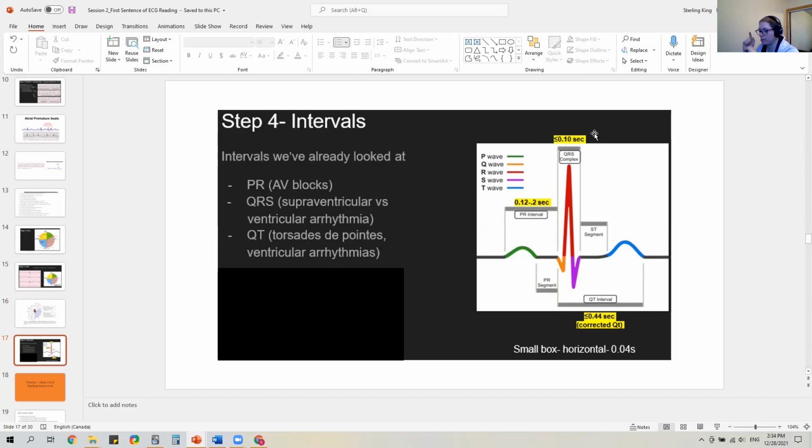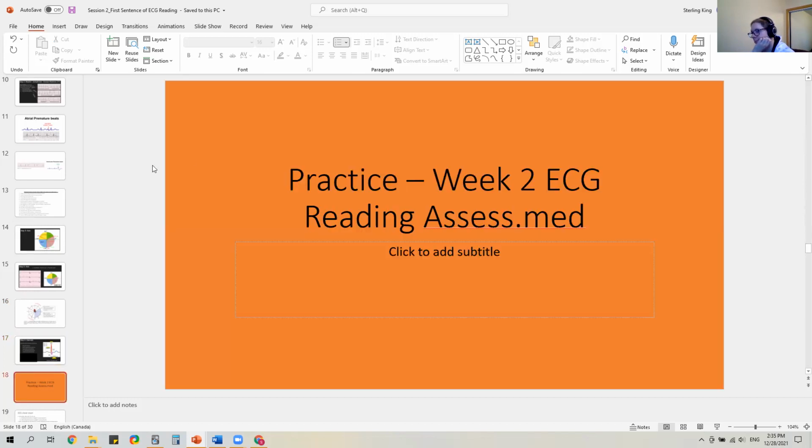Generally, you can eyeball it once you've read ECGs for a little bit. And if it doesn't look narrow or kind of pointy, it's probably not right. And then the last one is the QT interval, 0.44 seconds. When we were in it, Dr. Segal and the other cardiologists that we had basically said if it's less than half between the complexes and it's not tachycardia, then it's normal. So less than half between R to R, it's normal.